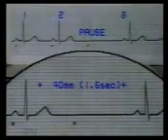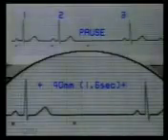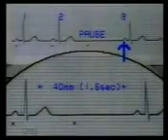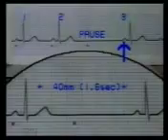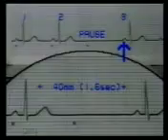If the sinus pause is longer than 1.5 seconds, then it is termed as sinus arrest. This is sinus arrest. When sinus arrest occurs, the SA node may recover and resume the function again, as has occurred in this case after 1.6 seconds. Or if it doesn't, then some lower ectopic focus will fire an impulse and stimulate the heart.